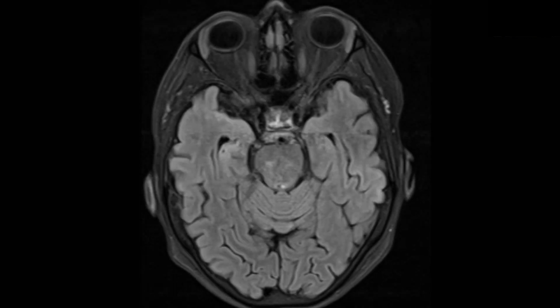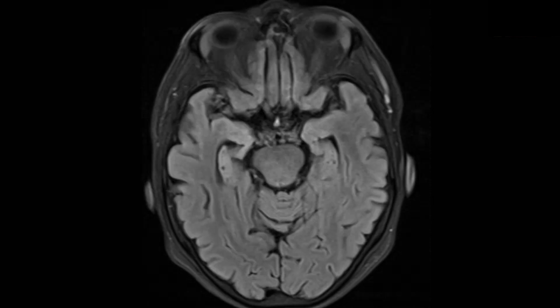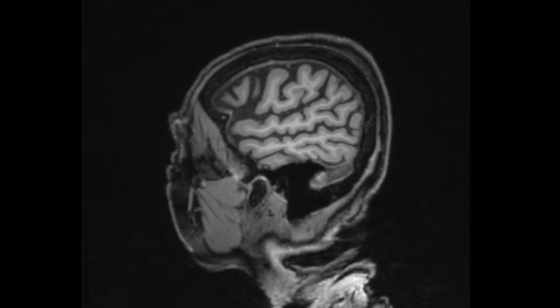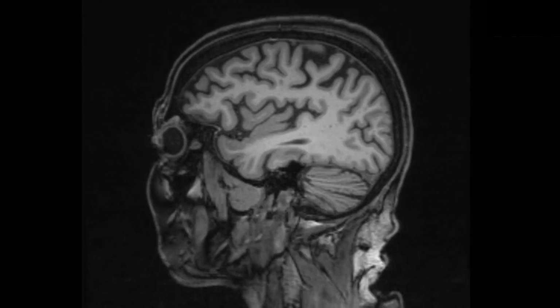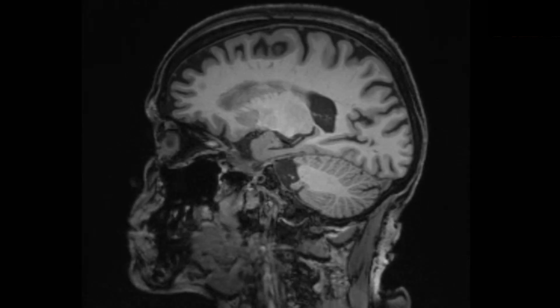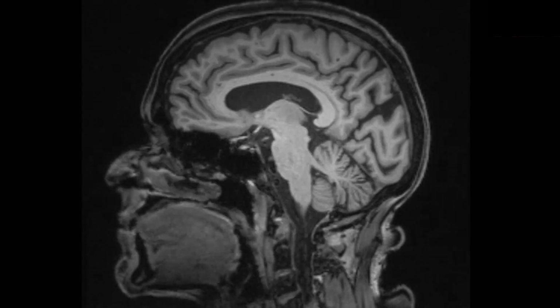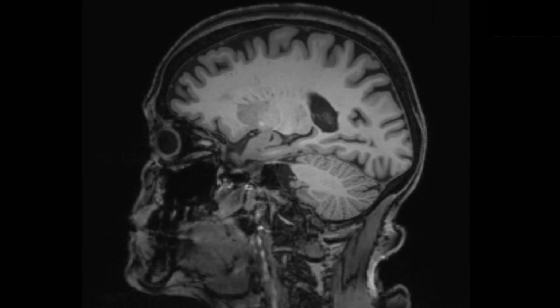If we specifically focus on the temporal lobe, we do not see any noticeable enlargement of the temporal horns in the axial slices. Let's move on to the sagittal view. Here too, the cortical rim appears well defined. In the mid-sagittal plane, both pons and midbrain are normal. There is no apparent atrophy in the parietal lobe, and the same is true for the contralateral side.